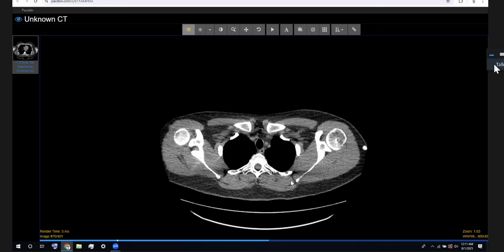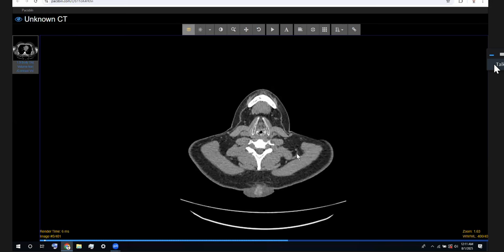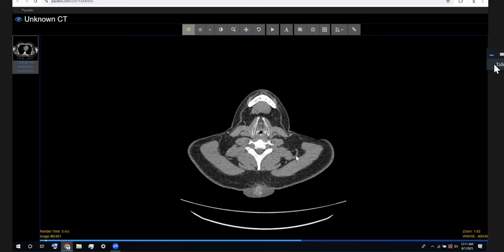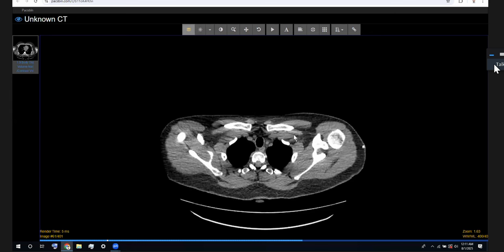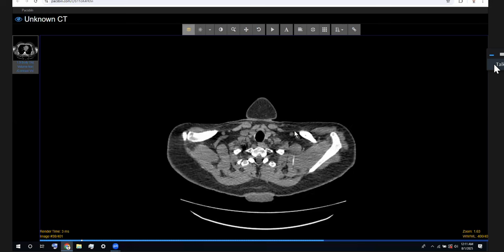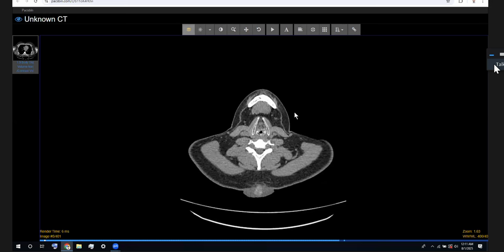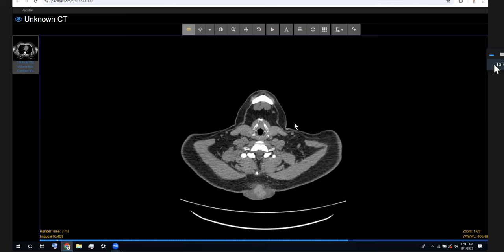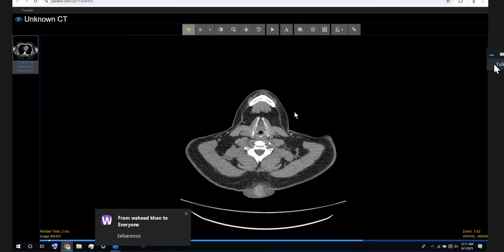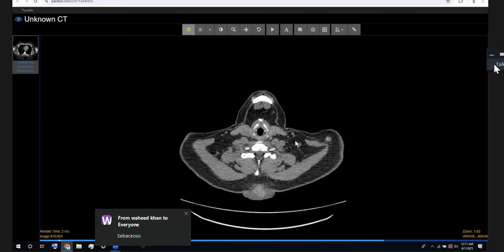So that lesion you saw on the chest X-ray, is that what's causing it, this thing in the subcutaneous tissue? Yeah, it is, isn't it? So this is an external thing. It's not a mediastinal mass. It's a sebaceous cyst, infected with secondary fat stranding. You can also see some small linear hyperdensities. Yes, I think it's infected. That's right, infected.